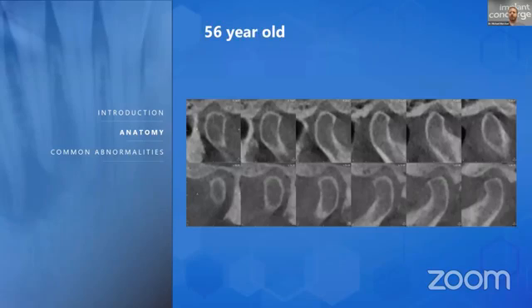And so here's an example. Now, if this was a 22-year-old that came into the office and you started to see some of this flattening, you might be concerned. Now, it's not severe, but it's something early. This is something now you want to get your patient into a night guard.